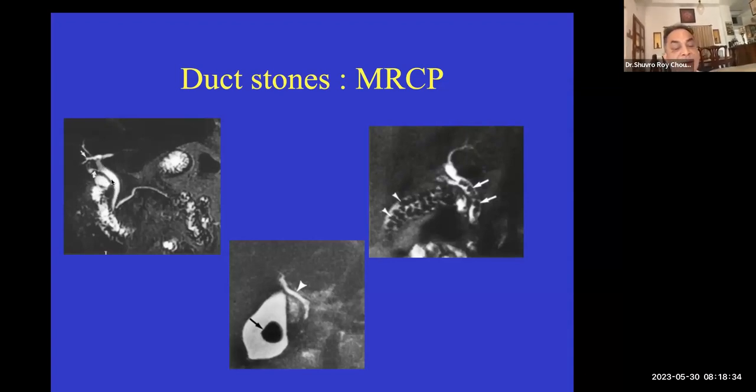you could say, depending on the age of the patient, of course, that there is a little bit of dilatation of the proximal CBD, and there is also some prominence of the pancreatic duct, right? So not quite a double duct dilatation, not quite, but I would look very carefully at the thin section at the ampulla to see whether there is any soft tissue mass, whether there is any possibility of stricture. We'll talk about a lot of other things that can cause this appearance.